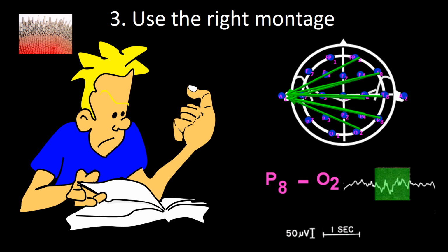Using long distance recording, as you can see in this frame, going from P8 to A1, the activity can be better visualized.